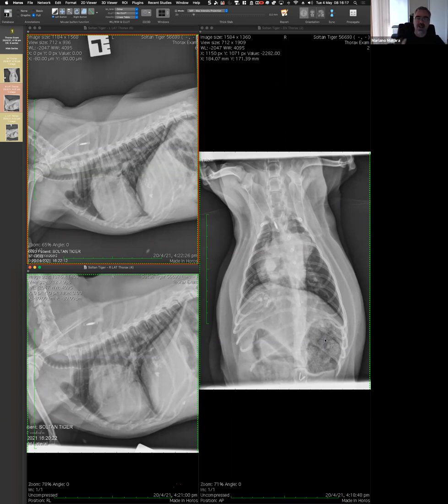So it's not unexpected, but let me rephrase that. If we want to blame the lung only, and this is not also true, then probably it doesn't look that abnormal to justify the dyspnea. So if we make that assumption that the lung is to blame, then probably the lung doesn't look that abnormal. Having said that, in cats you have a tiny bronchial pattern, and that can be a functional thing, and it can be super dyspneic, and radiographically there are only minor changes. But I take your point that at least at first impression, the lung doesn't look white.